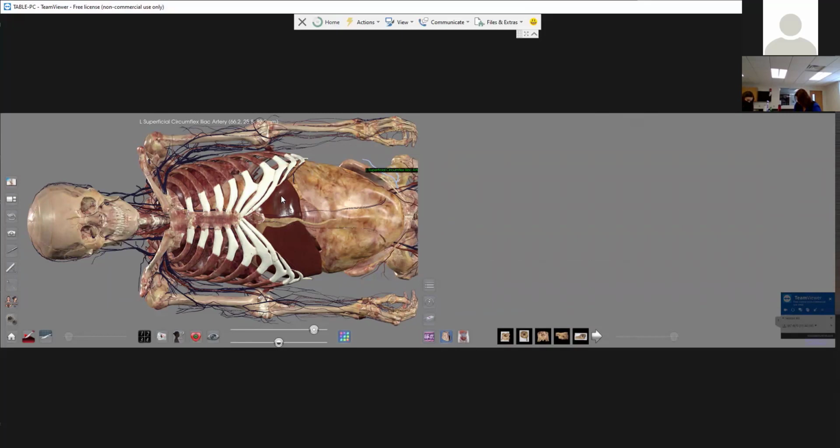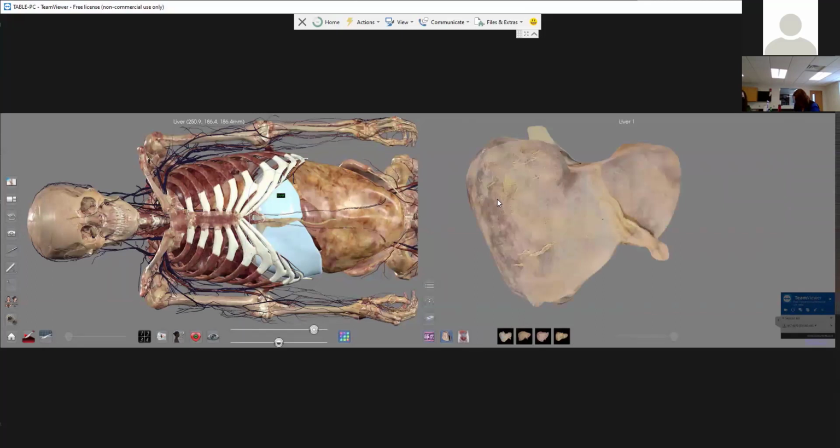The next one down the line is this middle one, which is our prosection. So prosections similarly are just donated. These are 3D images of organs. So if I click on my liver, because this is linked, it's going to suggest some relevant structures, in this case, all livers. And I can click on them to render this 3D image of this organ.